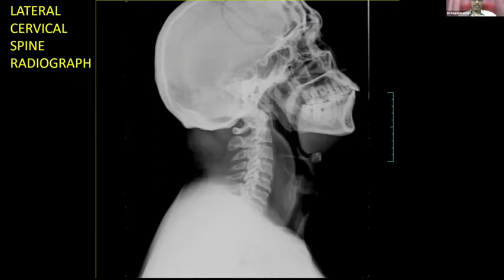So what feature do you have to look at to say whether it's spondylodiscitis? On X-ray, basically, you have to look at the vertebral body and the IV disc, isn't it? Yes. Whenever you are seeing any prevertebral soft tissue, then you have to look at the vertebra. Is there any vertebral collapse? You have to look at the intervertebral disc, whether any disc is involved. So any features of discitis, as well as any foreign body, either a fishbone, a radiopaque foreign body, which is causing an abscess. So these are all the common things.